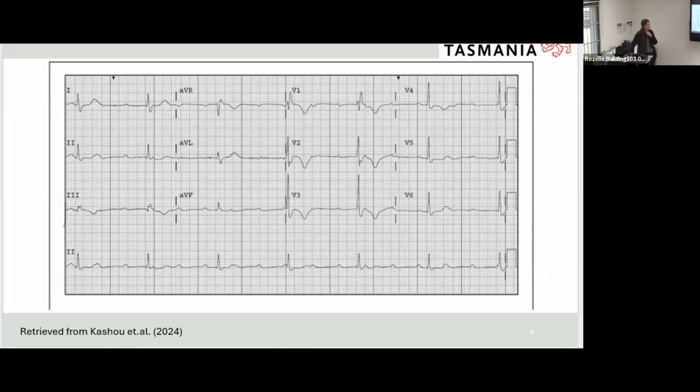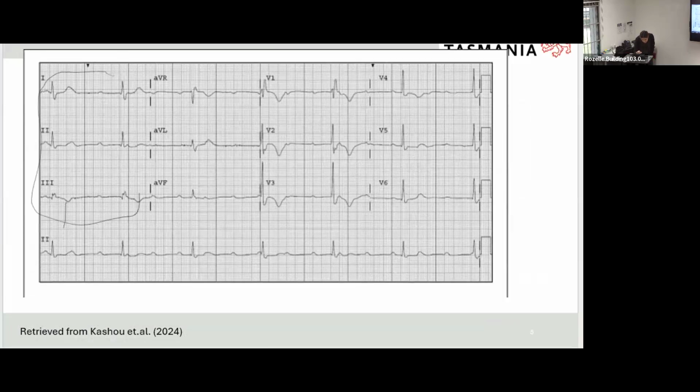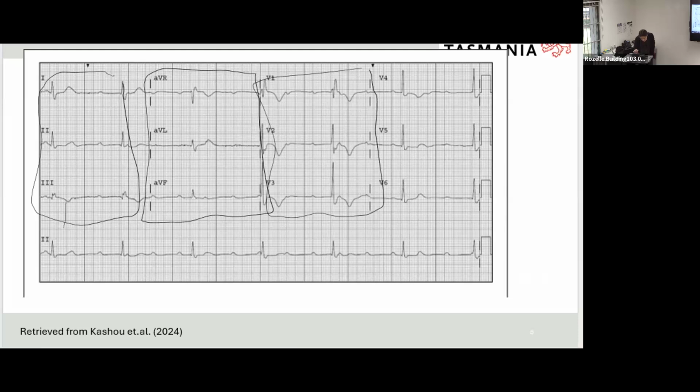Sorry, Nina, I think I asked my question. With regards to lead 1, 2, and 3, and then these sections, these are not correlated to time, are they? Because they're 2.5 seconds. Is that right? There should be about a 2.5 second block. Yeah, it's showing you as blocks. It's running across in time, but it's not a full lead strip, is it? Not a full lead strip, that's right.